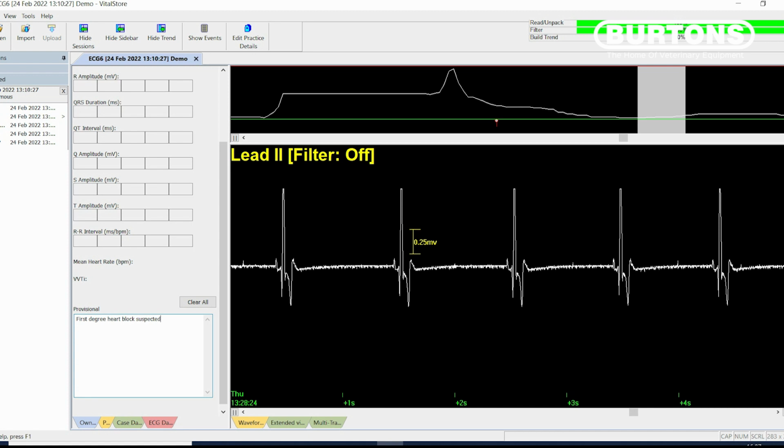There are a few things I haven't gone into in much detail, but could be covered in a further video. So for now I'm going to leave this, and we're going to look at some of the other tracings and see what we can do with those.